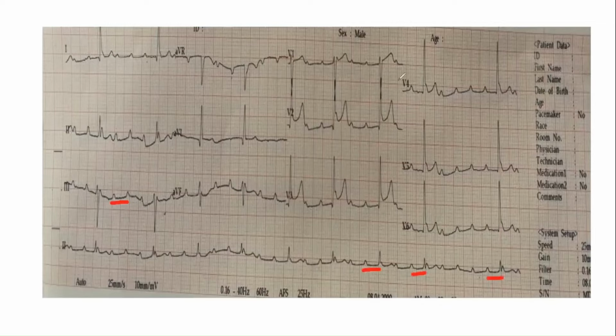It was a functional block because of such rapid conduction because of atrial tachycardias. So this was an atrial tachycardia. Okay, you can confuse it with a complete AV block, but look at the sinus rate. It cannot be so fast, even with so much sympathetic drive as well.